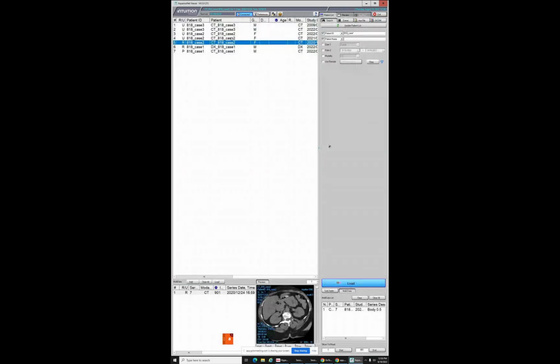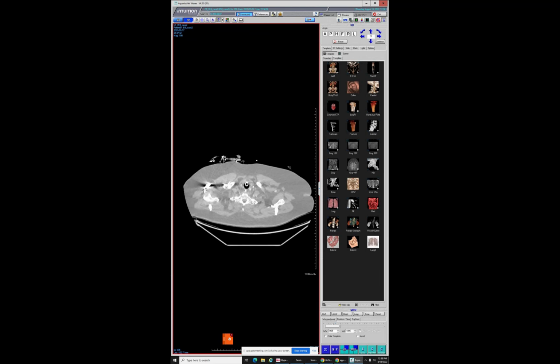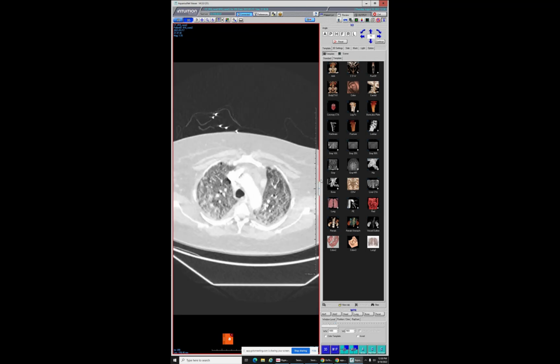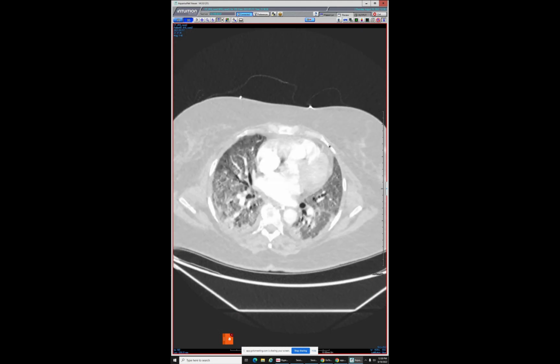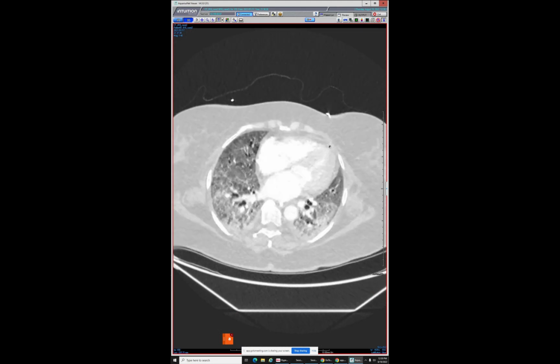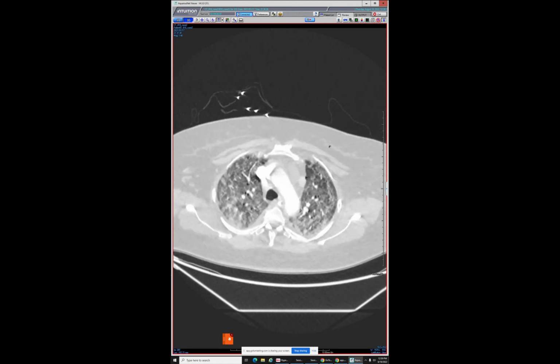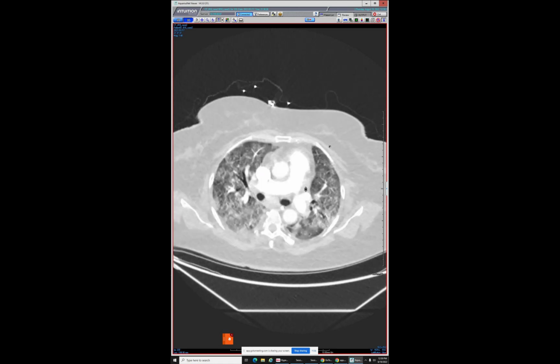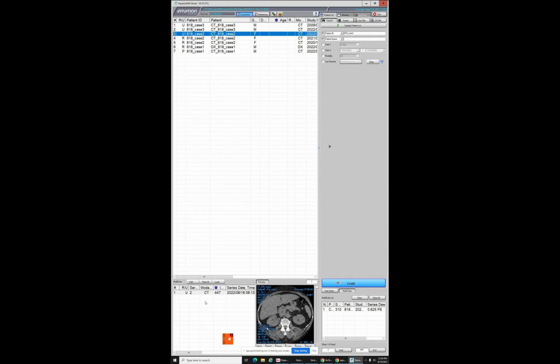Here the patient is a few weeks later, and you can see she's got the good old trach, and now she's more in the organizing phase of DAD, whatever you want to call it. Doesn't look good. She was trached in the hospital for a good month and a half, and then we had a follow-up of her today, and I'm always impressed.